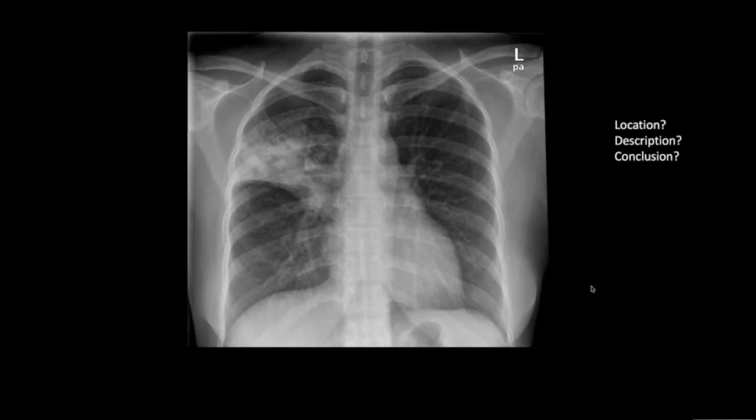The most common cause of lobar consolidations like this is pneumonia. It should be correlated clinically. Other causes of consolidations include hemorrhage and malignancies such as mucinous adenocarcinoma, but they are less common as compared to infection.